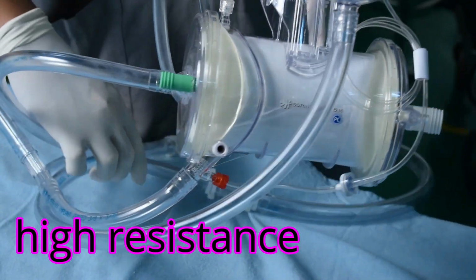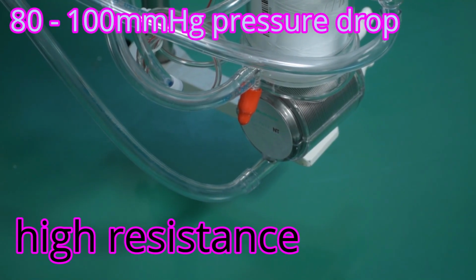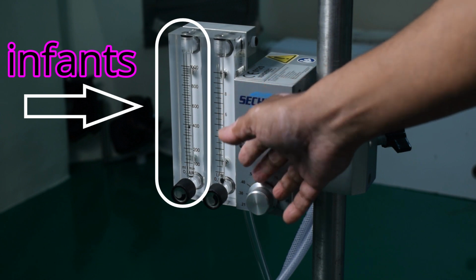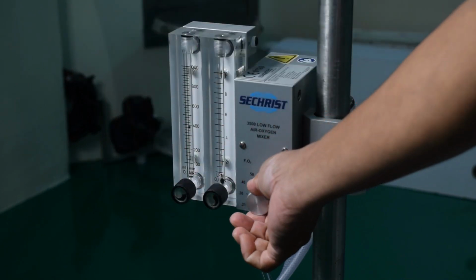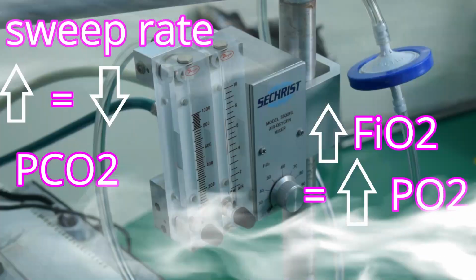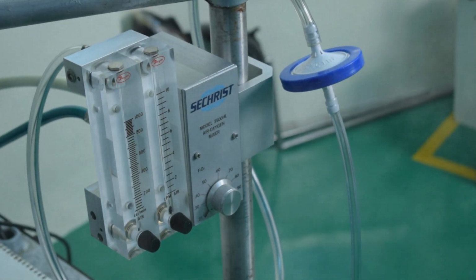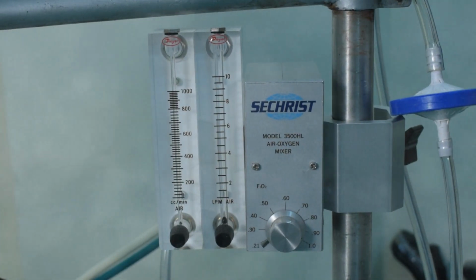The pressure gradient across a membrane oxygenator is in the range of 100 centimeters of water, and it's around 30 centimeters of water in a bubble oxygenator. Independent regulation of the partial pressure of carbon dioxide and oxygen is possible by varying gas flow rate and FiO2 with membrane oxygenators. Now, the gas flow through the membrane oxygenator is often referred to as the sweep rate. Higher rate of gas flow will eliminate more carbon dioxide from the membrane surface, thus increasing the gradient from the blood to the gas phase and thus decreasing the arterial PCO2.